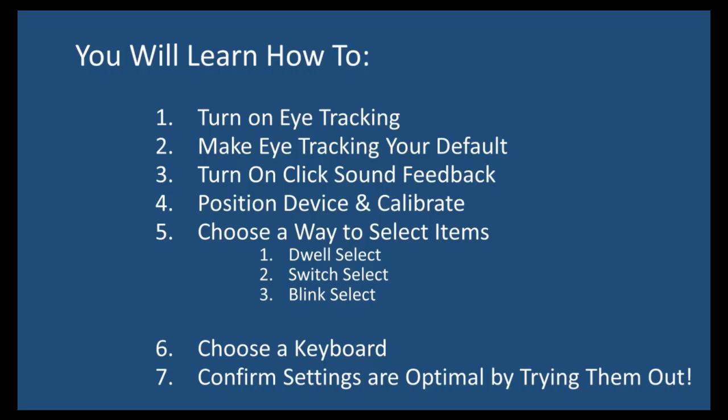Starting with the right setup, which I teach in this video, is essential for success. A caregiver is required for this initial setup, but users can independently adjust eye tracking settings afterwards.